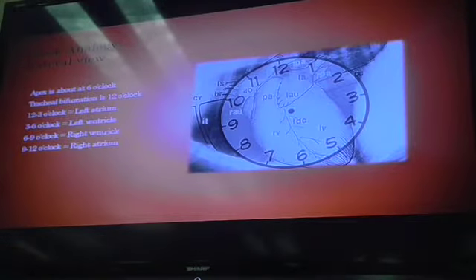Okay? So what you guys will see me talk about more on Monday, just in the interest of time, is the position of the carina. Okay? If that's enlarged, we're thinking something more left-sided, like the left atrium is most commonly the cause for the carina to be pushed upward or displaced forward. But just know that there is a clock analogy that is used with your lateral view. But again, the most commonly used one is going to be that of the VD and DV clock analogy. All right? Any questions so far?